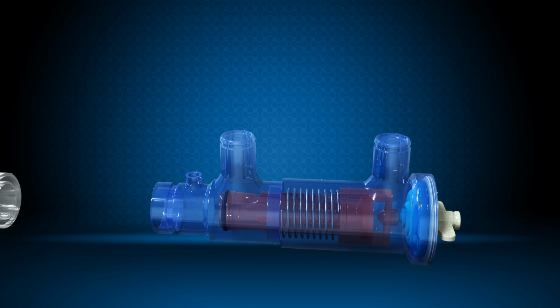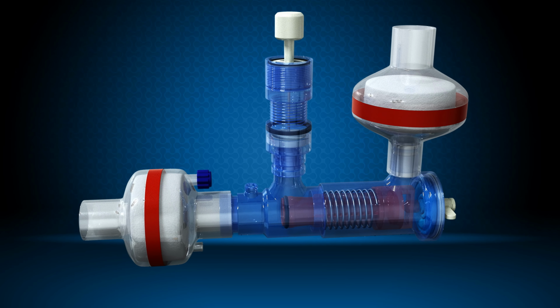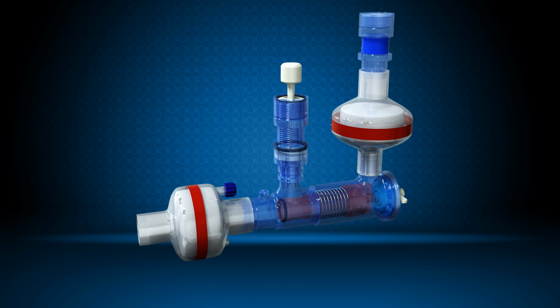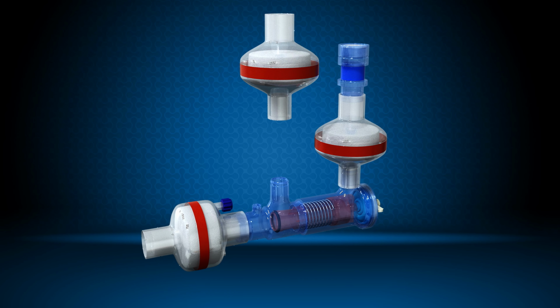Filtration of the optional circuit. Filtration can also be added to the optional circuit. Again, an HMEF filter is recommended for humidity and viral protection. The clinician can also add a filter between the PEEP valve and the phasotron body if so desired.